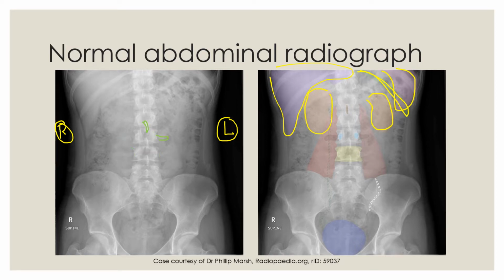We can also see muscle in this radiograph, and muscle is represented here. So the main muscle that we can see is our large psoas muscle. We can also see bowel loops, and actually some of these loops are fecalized. So fecalized means containing feces. So we have our ascending colon, which contains loops of fecalized bowel material. We can also see that there is splenic flexure, descending colon. We've got a bit of transverse colon here as well.